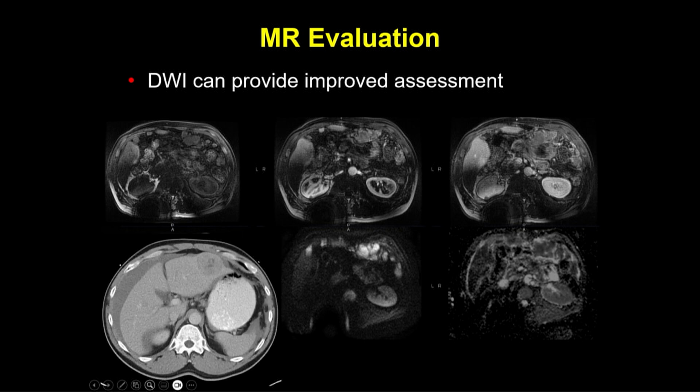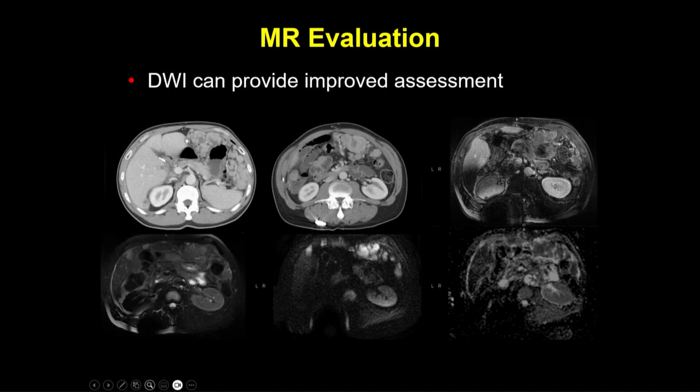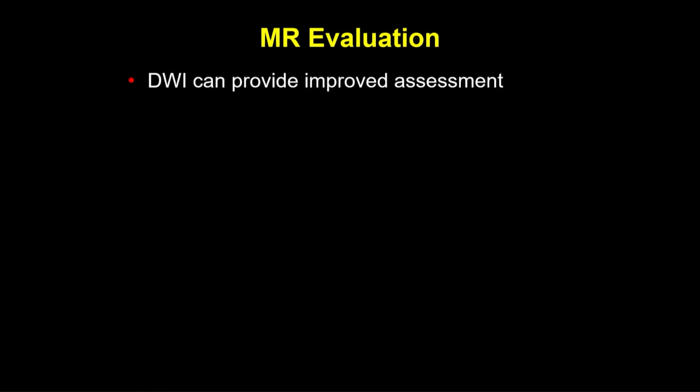But this was a patient that had an HCC that had presented with hemoperitoneum. This was the original CT. And so unfortunately, they just seed their peritoneum when they present with that rupture. And now this is what the patient looks like. So on CT, I think we would never miss this. I have seen it missed more often on MR, just because we're not used to looking, I think, for carcinomatosis, although some centers are using it for pseudomyxoma and so forth.